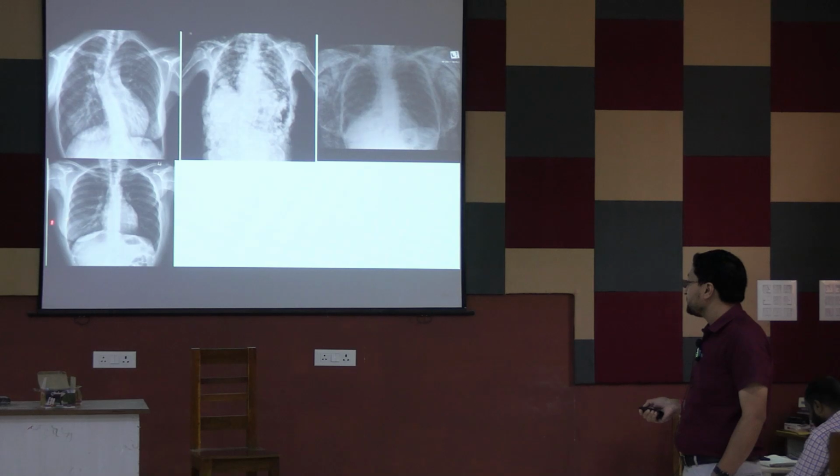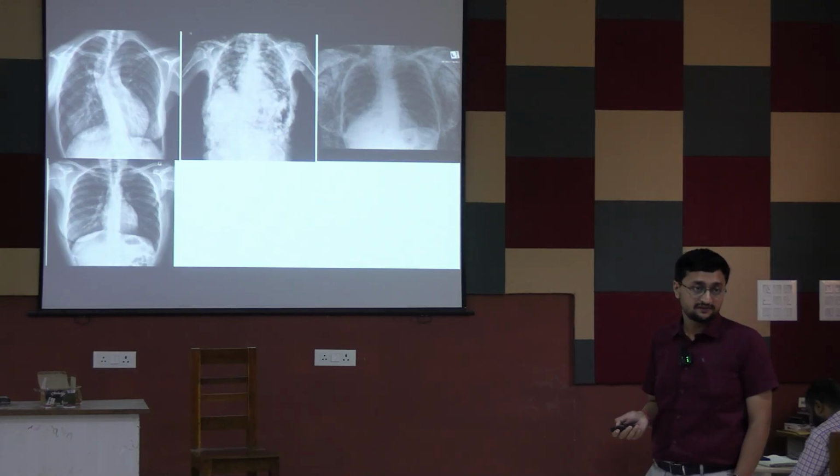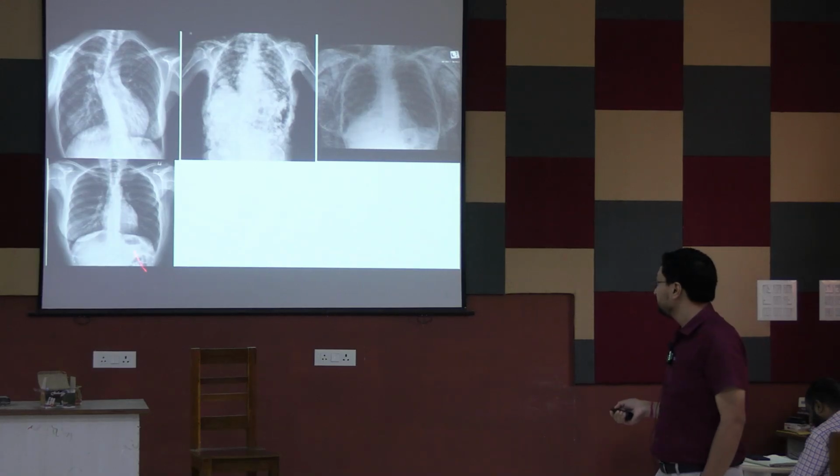This is the right breast shadow but the left breast shadow is absent. Is there any breast shadow here? Probably the patient is a known case of breast cancer and post mastectomy status, right? So this is important.